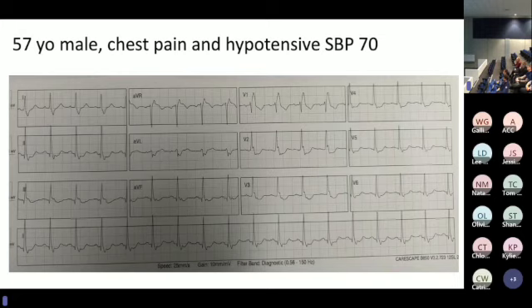What do you expect the echo to show? Angus, you've got the mic and you look like you're someone thinking. Just handed me the mic. Just not intentional. The thing that jumps out here to me is the massive R wave, S wave. The upright R wave in V1. Just very unusual. That doesn't look good. Yeah, it's huge.